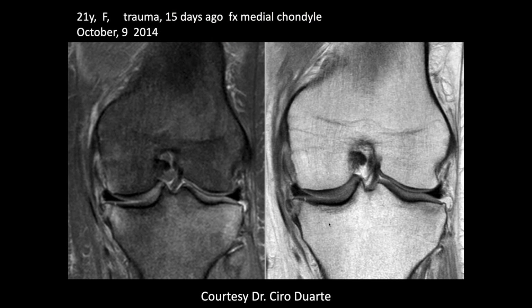Okay. Let's see. Michael, what do you think of this? Some coronal images of the knee. Just looking, there's some fluid signal adjacent to the medial femoral condyle, and also along the tibial plateau, there's a hypointense lucency through it. But this says trauma 15 days ago. Fracture medial condyle.